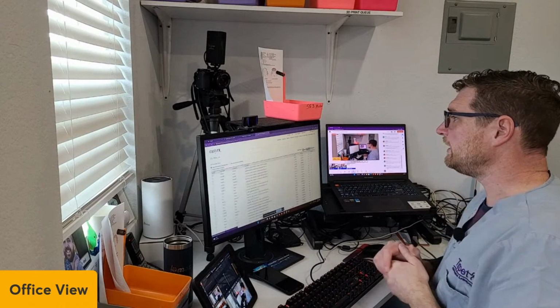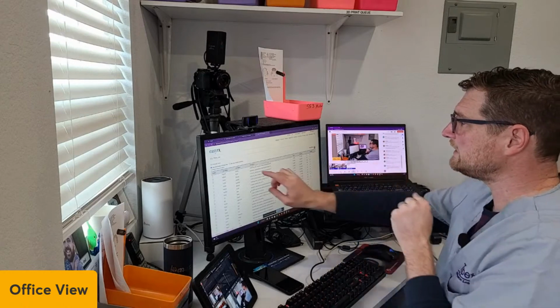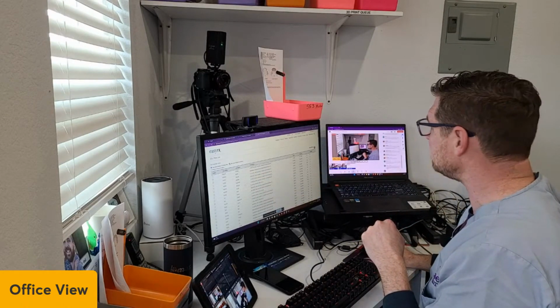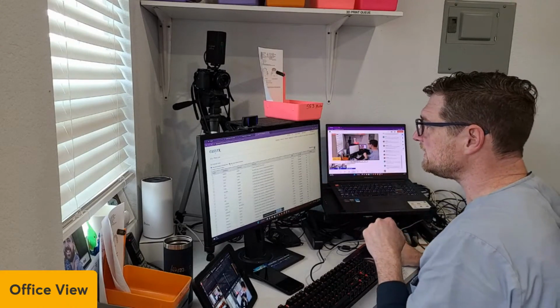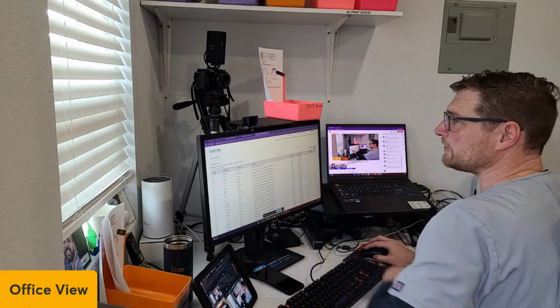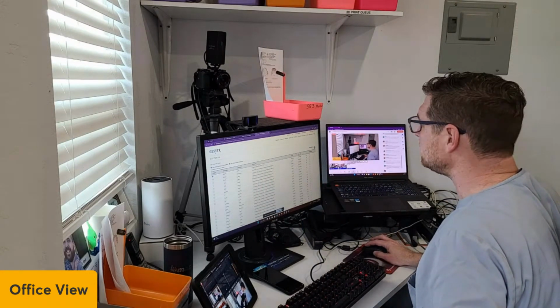And you can't see this very well, but here it is, right here. So if I actually click this and remove all the ones I've already printed, it's right here at the top, Addison Moore. So I'm actually just going to click this, click print it, meaning I'm sending it to the printer. And so then I can filter it out of the list later.